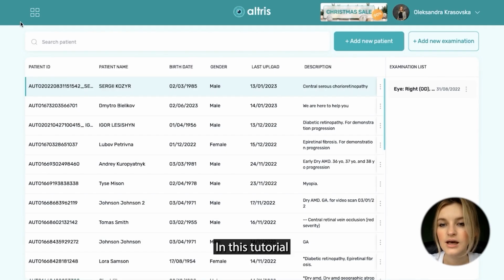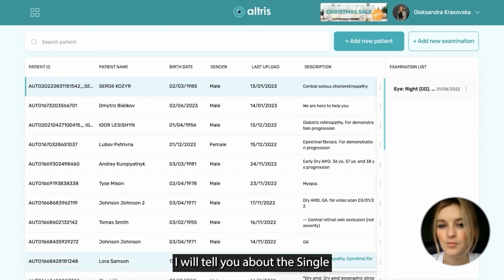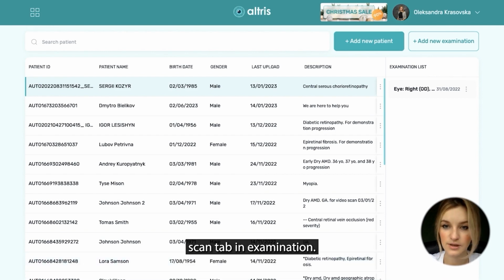Good day! In this tutorial, I will tell you about the single scan tab in examination.